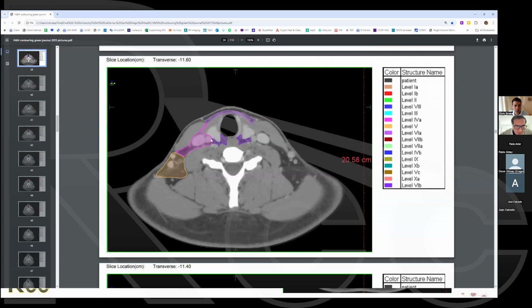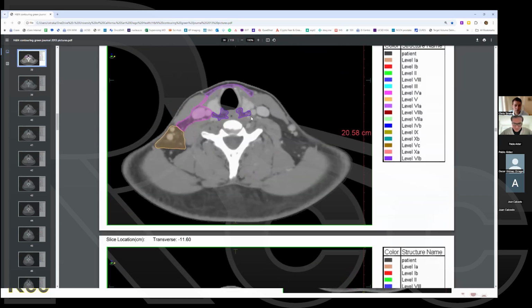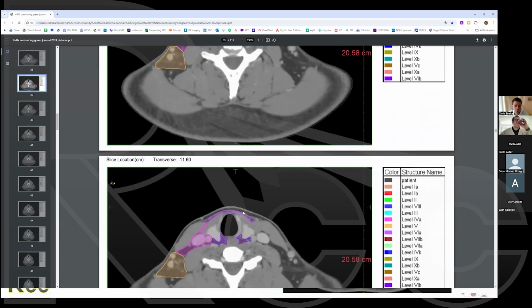So basically, you can see here, contouring this as cleanly and as clearly as they've done is just very difficult and would be extremely time consuming to do in clinic. So usually the contours are going to be a little bit less, without all these complete twists and turns. And then often for locally advanced cancers of the hypopharynx or larynx, we're often covering down to the first tracheal ring. And so really this whole region here would end up being covered.